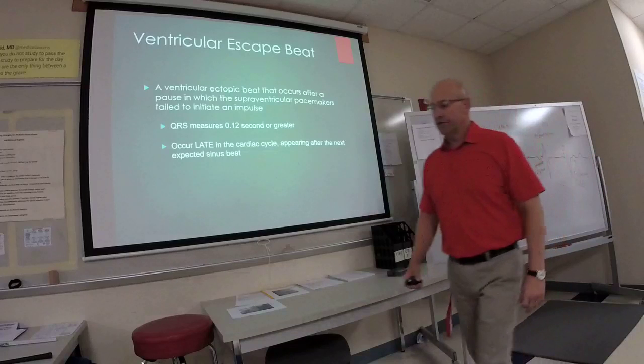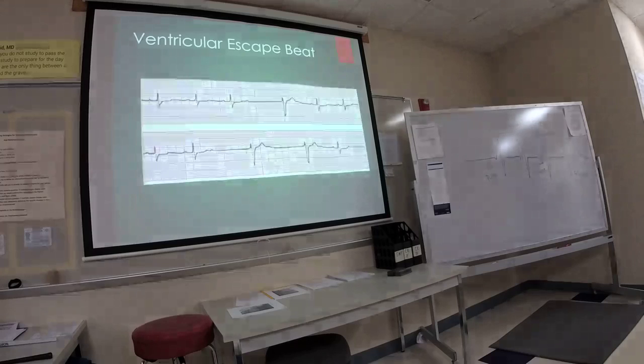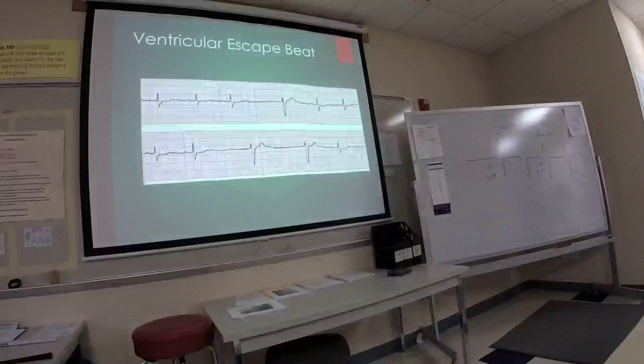So you have these ventricular beats. The rate depends on the underlying rhythm. Let's just look at one right quick. So you have sinus, sinus, sinus. The same thing with that junctional escape beat. Right? You have this pause here.